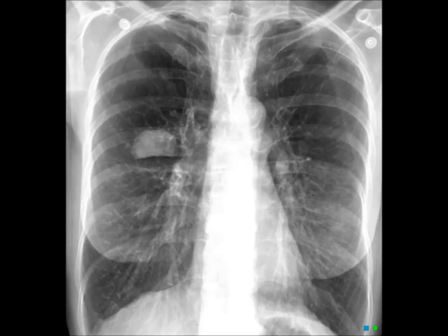4. Look at the big picture. When you're examining a patient, you observe the whole patient from the end of the bed before delving into small details, and it's the same with examining a piece of imaging. Look at the whole thing. Can you immediately see any obvious abnormalities like a large lung mass?